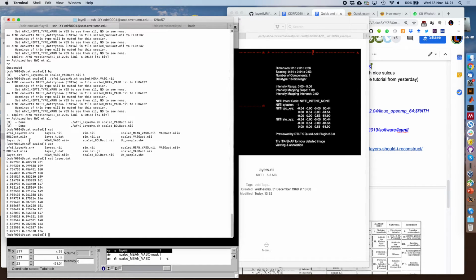So in an ASCII file, you have three columns. The number of voxels is here. This would be the standard deviation, and this would be the mean. Do you have any questions about that? Do you get similar profiles with your drawn masks? Did anybody draw the masks?